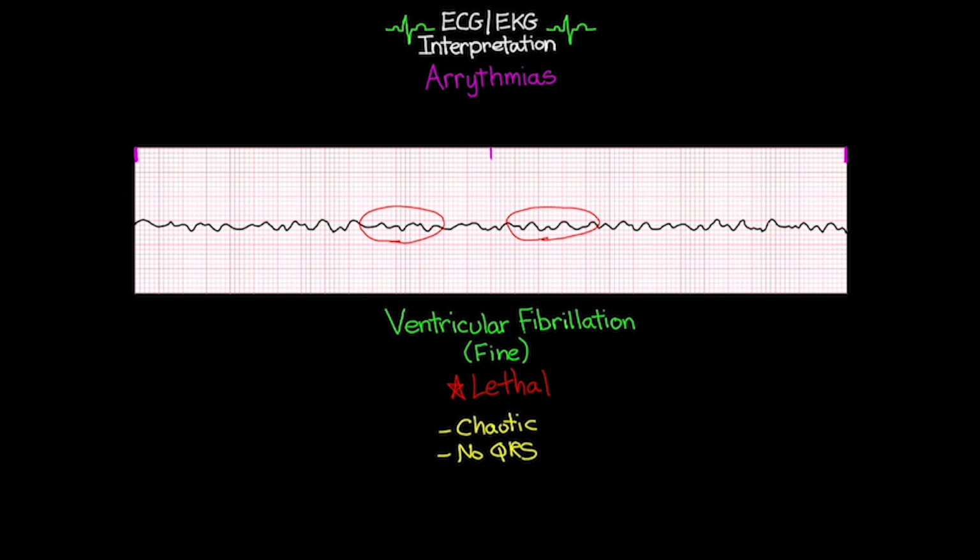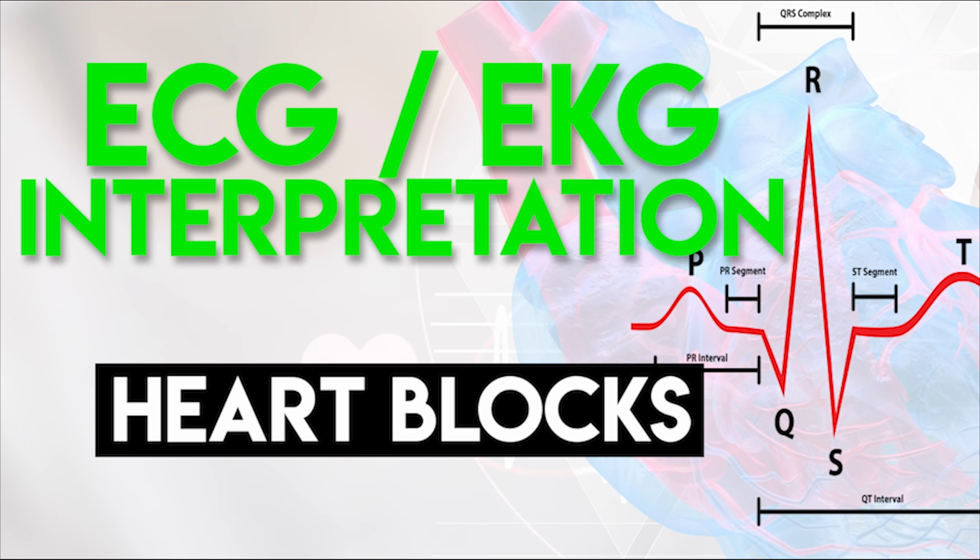Hopefully this lesson was able to give you the tools and the knowledge you need to be able to properly interpret these on a rhythm.